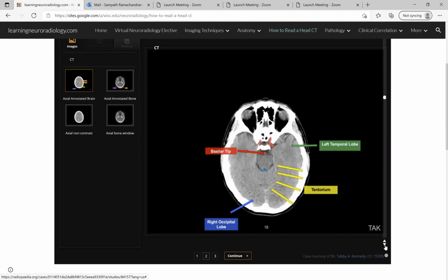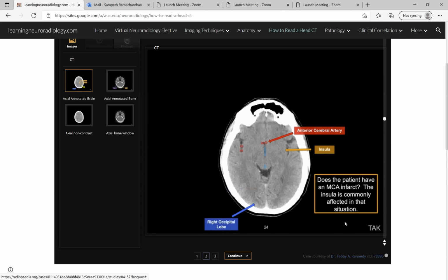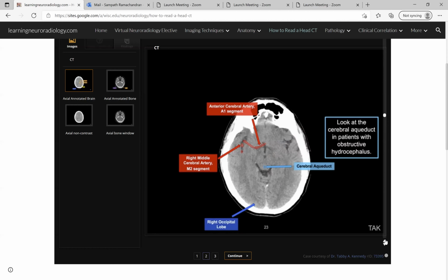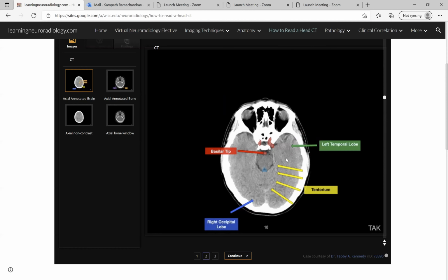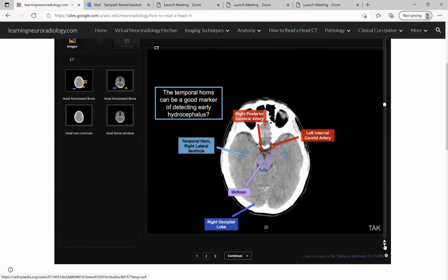It's kind of hard to see the temporal horn in this patient because it's probably a very young patient. They are barely perceptible. Temporal horns typically show a bit inferiorly, but I don't see them really well here because they're pretty small. So these small structures you can see, barely perceptible, are the temporal horns here. In very young people, because the brain tissue maintains substantial bulk, it's hard to see the temporal horns, but sometimes if you see them, you can see them quite well.